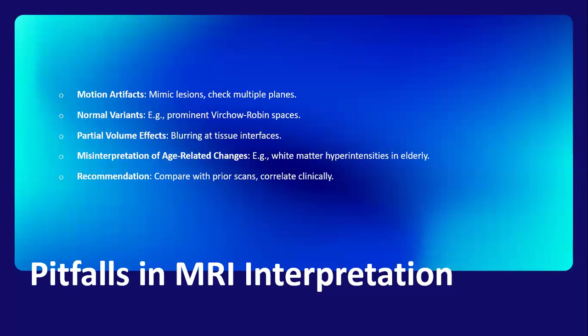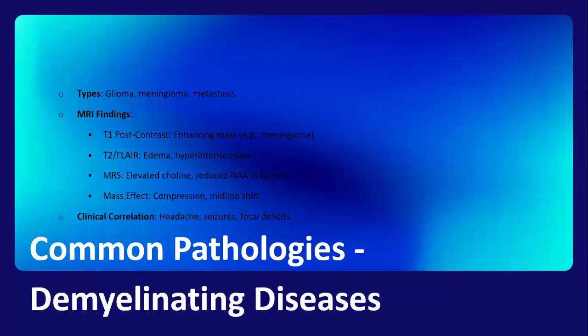So in demyelinating diseases, you will have a lot of hyperintensities, especially within the white matter, with regards to destruction of the myelin. An example is multiple sclerosis. But commonly, you'll have to correlate that with what you see clinically. Next slide, please.